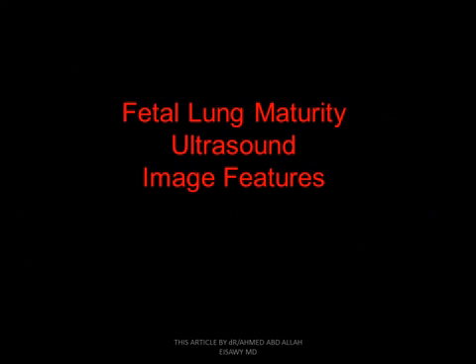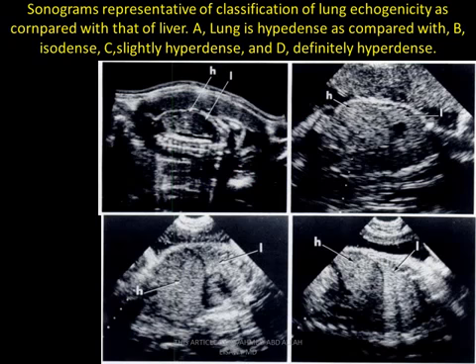Fetal lung maturity ultrasound imaging features. It's an interesting subject. Many theories and many studies talk about fetal lung maturity, and these are questions you face in our clinic. The obstetrician needs to decide whether to do early labor or not, and asks if the lung is mature or not mature, and refers to you to answer this question. In this slide we depend on comparing liver echogenicity with lung echogenicity, and this is the easiest way.